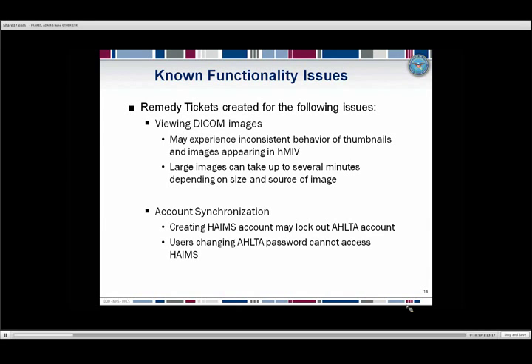Under the account synchronization, basically what we're saying here is as long as you know your AHLTA username and password, creating your account should not be a problem. Your system administrator will be able to help you do that. However, if you have some crazy characters sometimes in your AHLTA password, the system administrator may ask you to change your AHLTA password in order to create your HAIMS account.